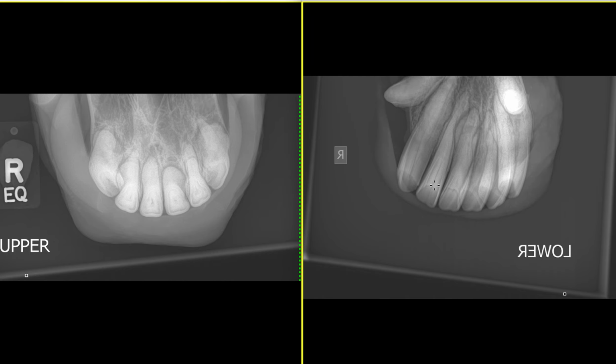So in summary, this horse has equine odontoclastic tooth resorption and hypercementosis. What we're seeing here is the hypercementosis, so this amorphous mineral material, and the reason that we can't see the roots very clearly is because of the tooth resorption. I hope that that is clear.